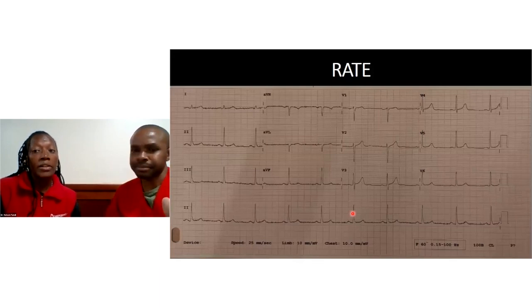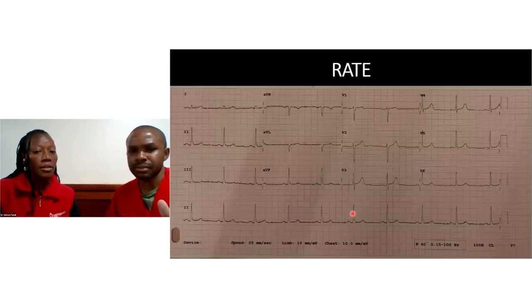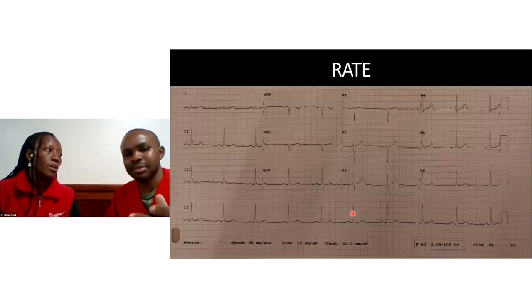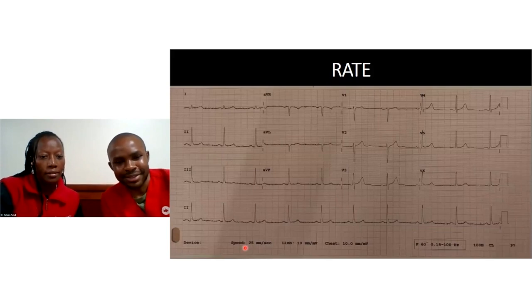If our patient has an irregular rhythm, and you're going to evaluate for regularity and irregularity, then you take this as a 6-second strip, and you count the number of QRS complexes therein and you multiply by 10 to make your 60 seconds. Do you want to do this for us right here for this patient?